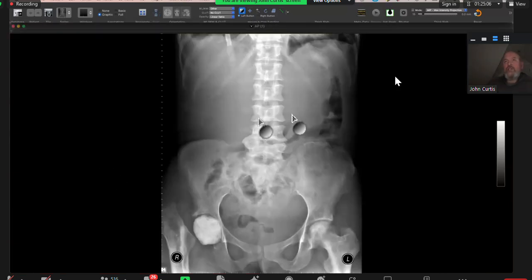Okay, we've got H-shaped vertebrae. We've got autoinfarction of the spleen. We've got avascular necrosis of the left femoral head. This is a patient who's already had a total hip replacement. That's been removed, and there's been a cement ball impregnated with antibiotics as a primary procedure before they have a total hip replacement. In other words, the patient's been subjected to an orthopedic operation because they've had AVN.